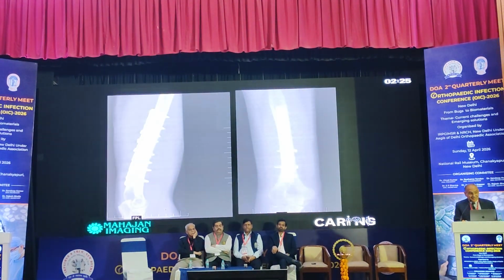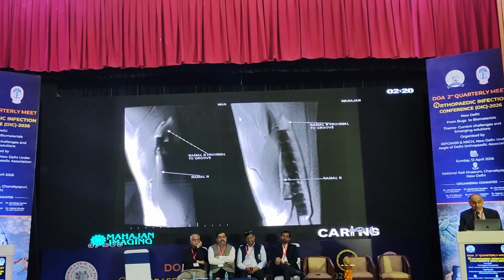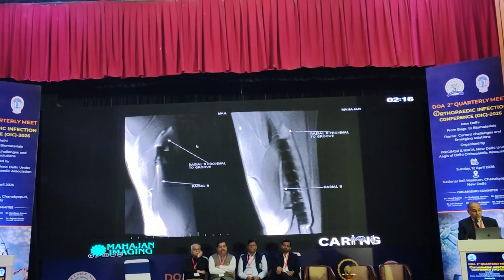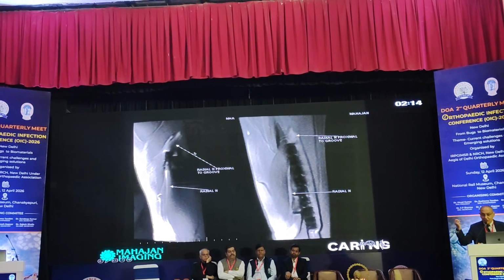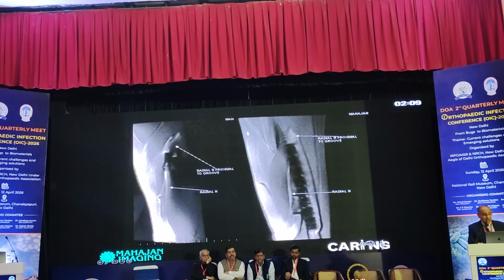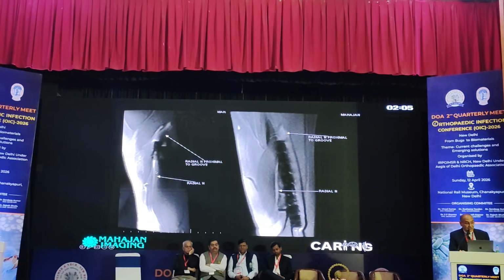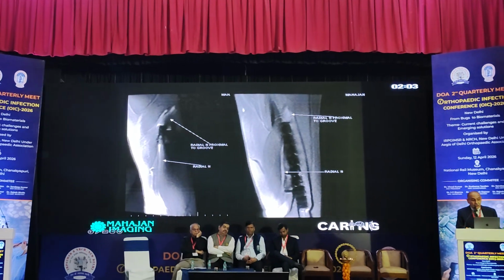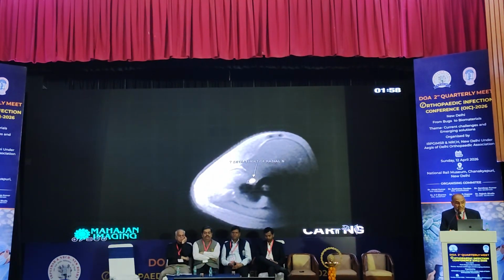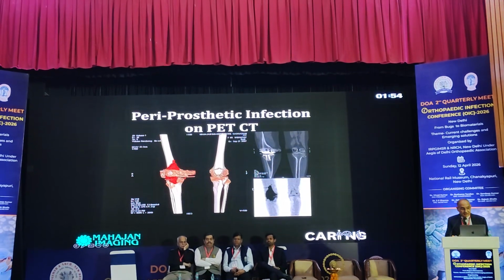This is another case again with this implant in place, and we were trying to see whether there was a radial nerve injury or has that happened? And this is radial nerve proximal to the groove, and this is radial nerve distal, could be seen very well even on the axial. And we felt that there was entrapment of the radial nerve in this case.